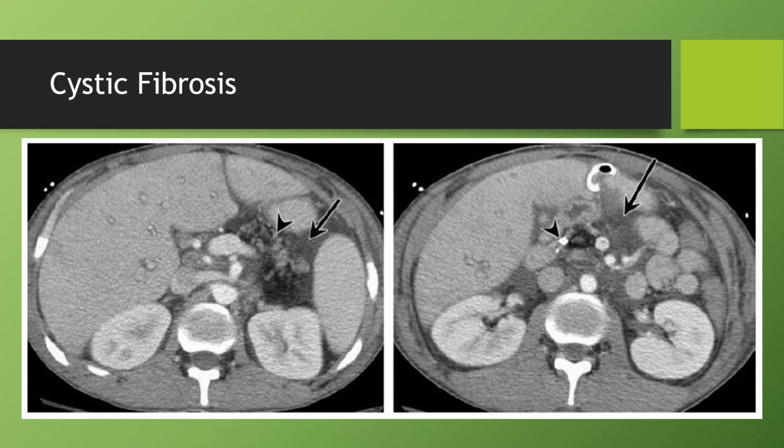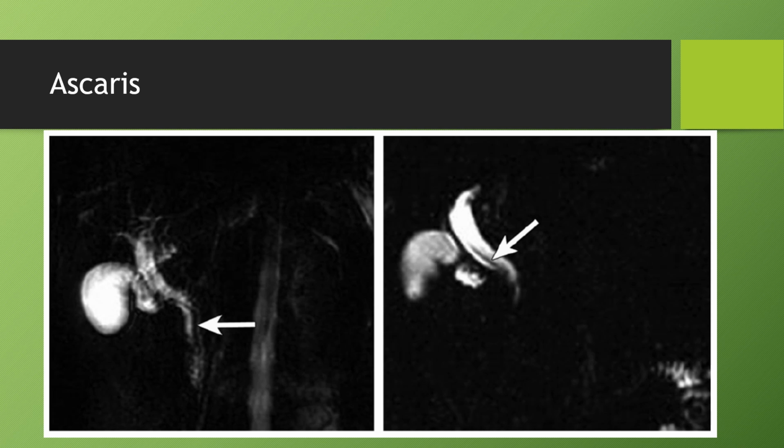Here's an image of the ascaris. You can see it within the bile duct on these MRCP images.